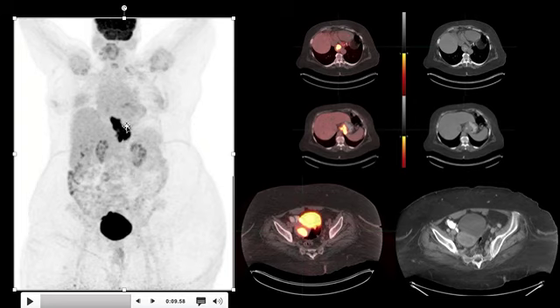We don't see any evidence of regional lymph nodes, although remember that for lower esophageal, GE junction and gastric cancers, the way to evaluate for regional lymph nodes is endoscopic ultrasound guided biopsy. We do FDG PET to look for distant metastases. So what explains this focus in the pelvis?